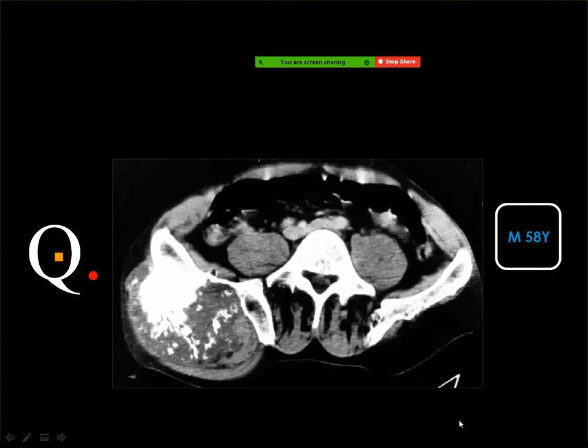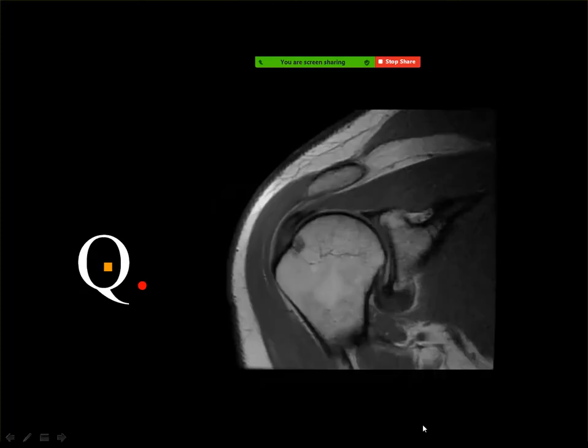And this is a CT scan of the chondrosarcoma. Yes, very good, chondrosarcoma. This is chondrosarcoma because of the mass with malignant criteria containing calcium. The possibility of chondrosarcoma should be considered.